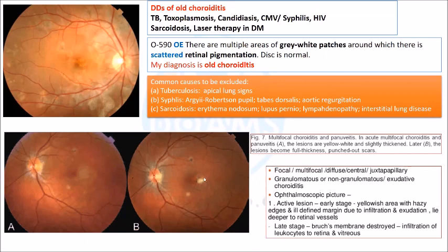Same area. Yes, sir. Same area. So this is advanced stage. When you find this clean cut white, it could be old choroiditis. So choroiditis may be in the macular area, peridisc area, other area, maybe focal, multifocal, diffuse, central, juxtapapillary. Papilla means optic disc.